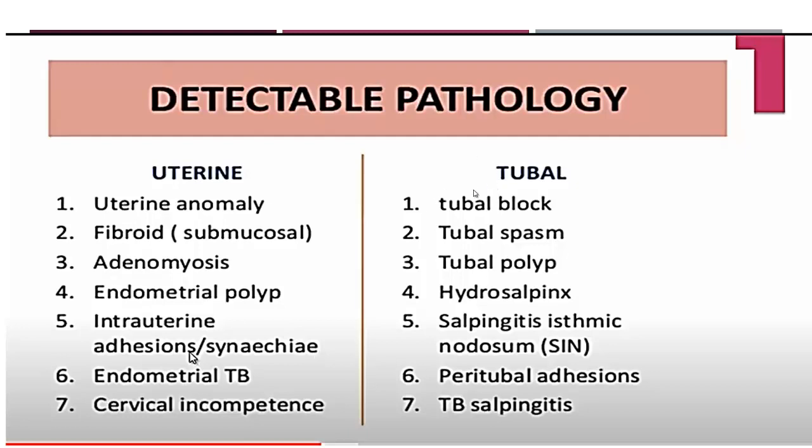Regarding the tubal pathology, we have tubal block, tubal spasm, tubal polyp, hydrosalpinx, salpingitis isthmica nodosa, peritubal adhesions, and TB salpingitis.